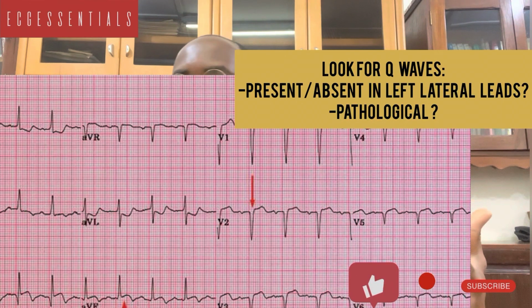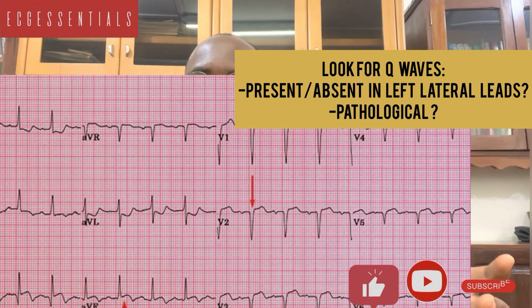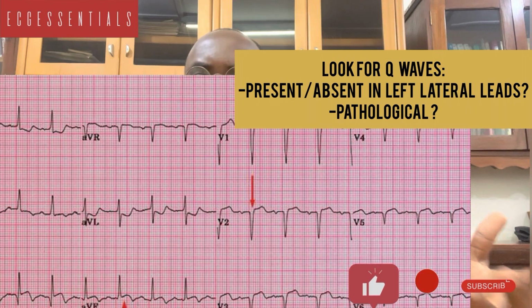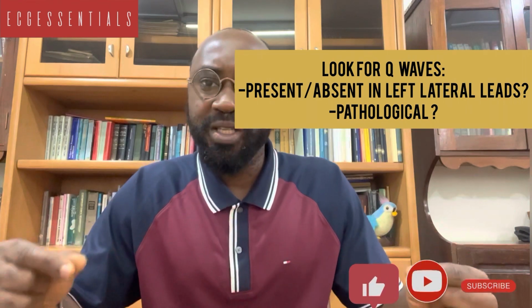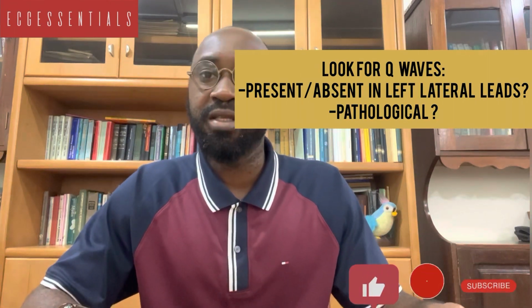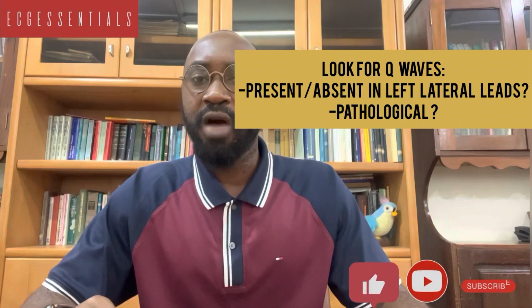And we said earlier that pathological Q waves are deeper and wider than the normal expected Q waves. And of course, we know where we expect to find the Q waves, in the left lateral leads. So finding Q waves in other places should raise some eyebrows for us to try to find out why they are there. All right. The normal width or duration of the QRS complex is between 70 to 100 milliseconds. Most texts will extend it to 110 milliseconds, but beyond that, it is abnormal.